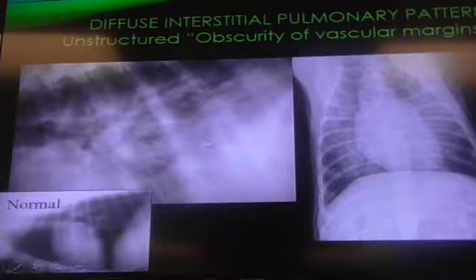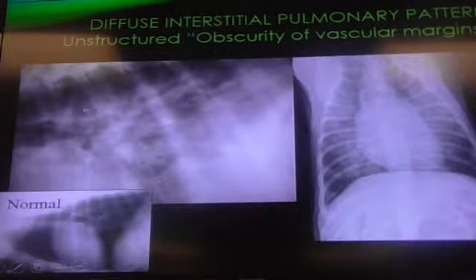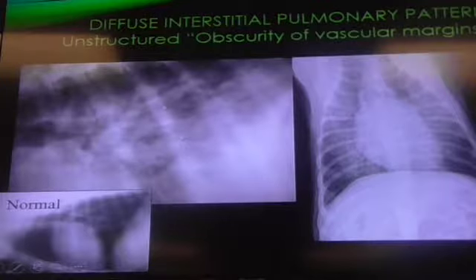On this one, do you see some donuts? Yeah. Are you seeing some donuts too? So there are some donuts, but like I told you, there will be some in the hilar area. But are you able to see donuts in the periphery? There are a couple. There are few. So in this case, if you have to pick one, compare this one to this one. Which one do you think is more prominent?